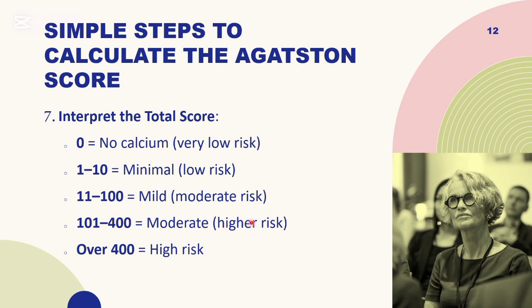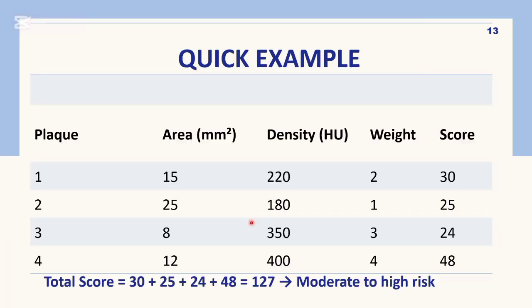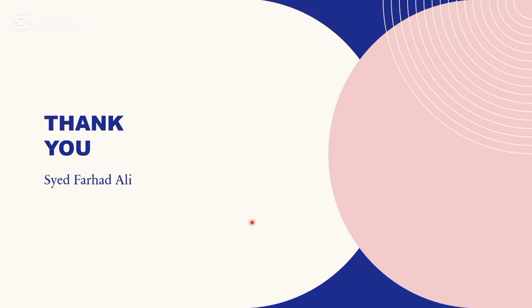This is a simple formula and it's a very important formula to find out the risks of heart attack. It is very important for the radiologist, for the cardiologist, and for the competent radiology technologists and radiology technicians. I hope you understood this topic well, and thank you so much.